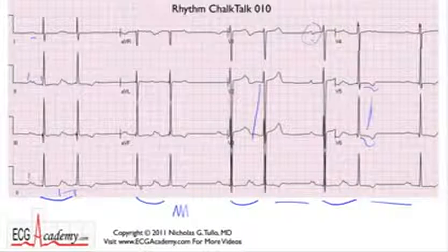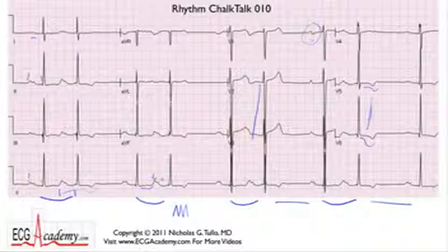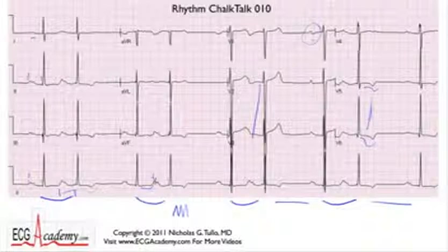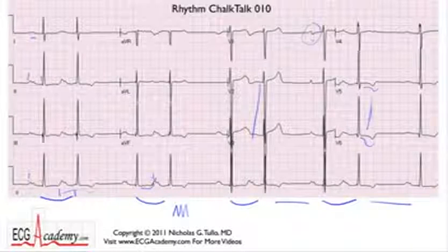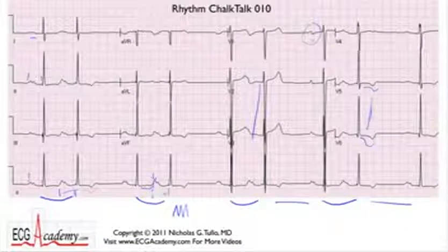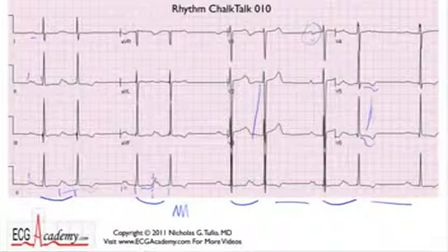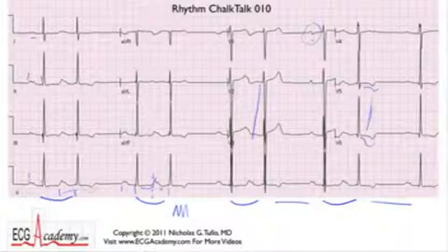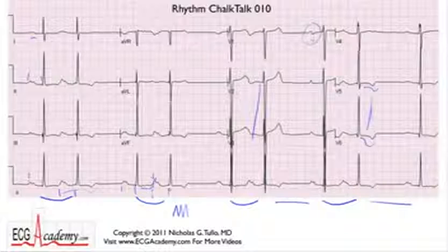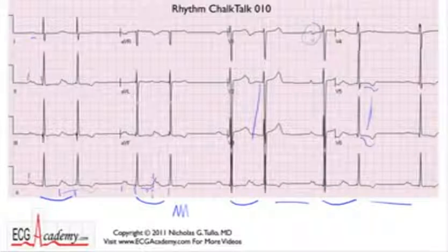And when you look at the T wave of this beat, you can see there's a very large bump right here at the tail end of the T wave. So I would say this is the start of the P wave in this beat, and the PR clearly gets longer compared with this PR interval. Yes, you can take calipers if you don't trust me, but my eyes are looking at this and say this is almost 360 milliseconds, very long.